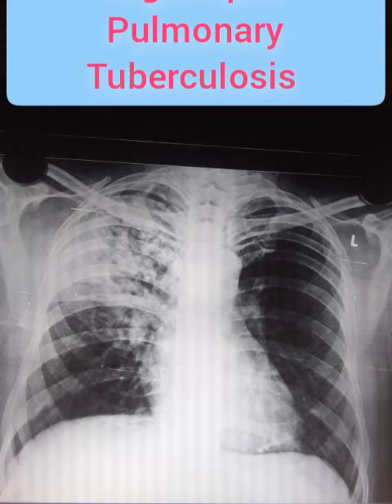In this first chest X-ray, we will look at pulmonary tuberculosis. In this X-ray, you are seeing the right upper lobe being affected by pulmonary tuberculosis. How will pulmonary tuberculosis look in a chest X-ray? It will look like fibrosis, consolidation. Fibrosis, consolidation, or any infective sequelae will look like a white cloudy appearance in the background of the chest X-ray. So we need to differentiate between consolidation, fibrosis, and tuberculosis. In pulmonary tuberculosis, in addition to the white patches, we will also see cavity lesions.